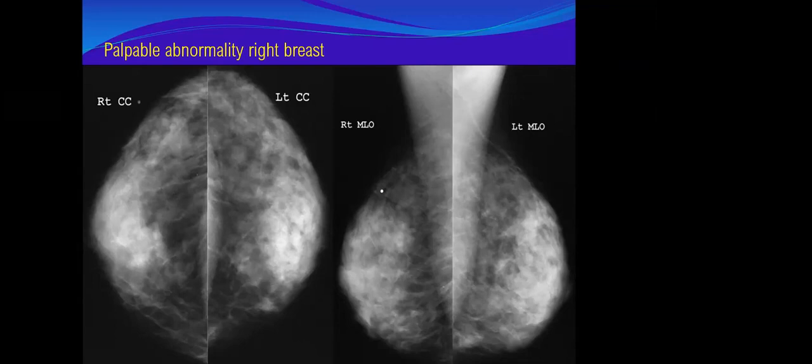I can see it in the CC view, in the mid-third of the breast.